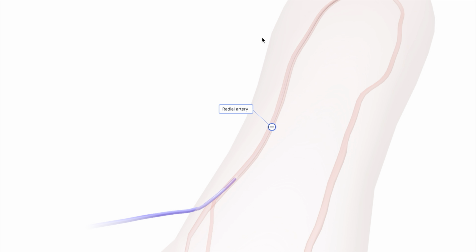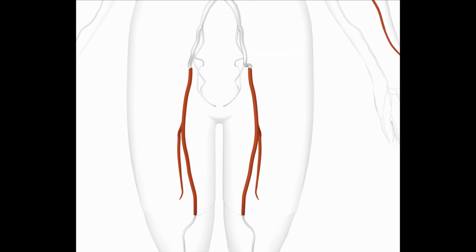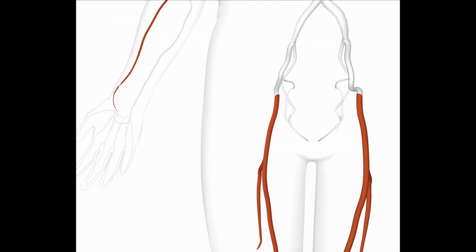Catheter insertion. During heart catheterization through the radial artery, the catheter is inserted into the radial artery through a small puncture at the wrist. In some patients, radial artery access is attempted, but the artery is too tortuous to successfully enter. In those cases, access through the femoral artery is performed.